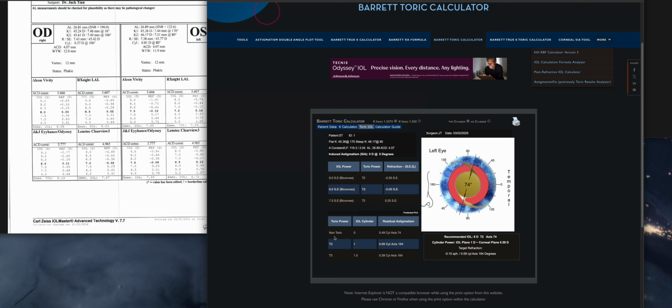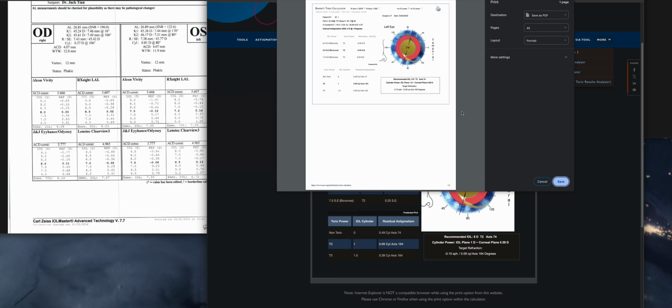Yeah, I'd say keep it with the rule, 0.5. Probably do an LRI to take care of that. LRI at 74. Yeah, so right, I think that's the 10th one.